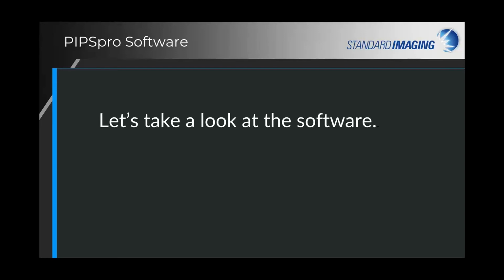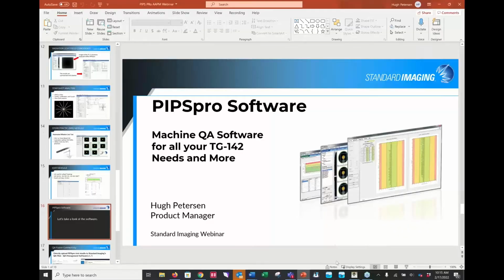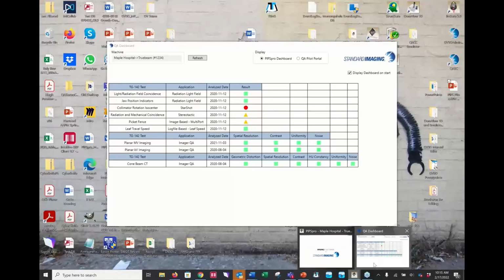And if any of you would like to see some of the tools more in depth and with more detail, please feel free to contact us, and we can set up a one-on-one demo for you to show you the software more in depth. But I'll just jump out of here and just jump into the software.